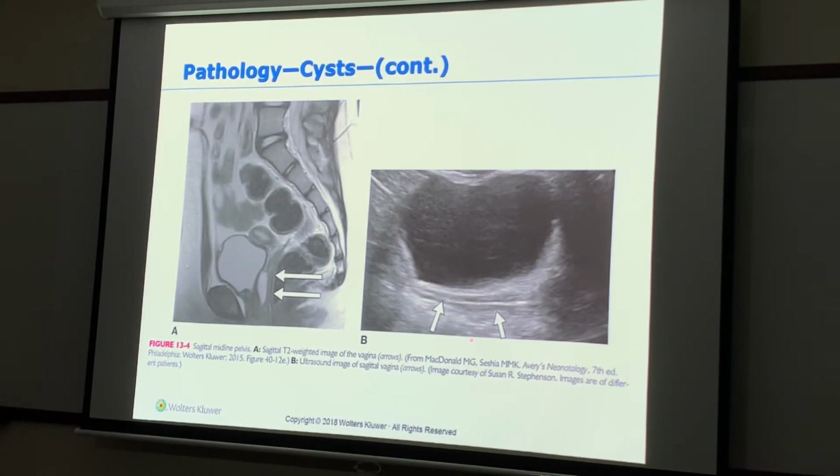Anterior, posterior, superior, inferior, because it says it's a sagittal vagina. Though it's just a canal that measures about 8 centimeters, those two walls touch one another, making the echogenic line because of physics.